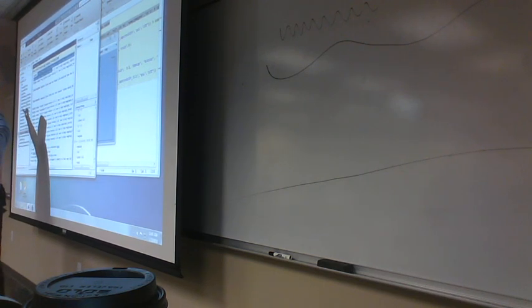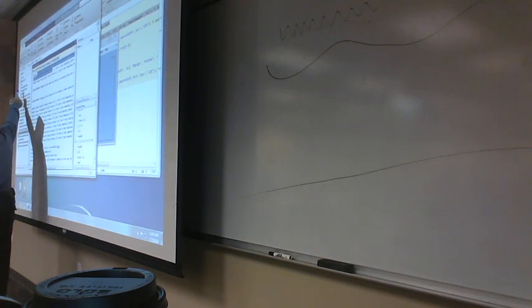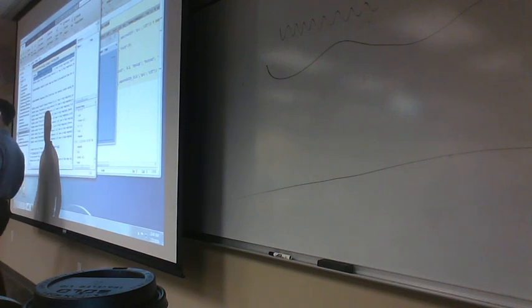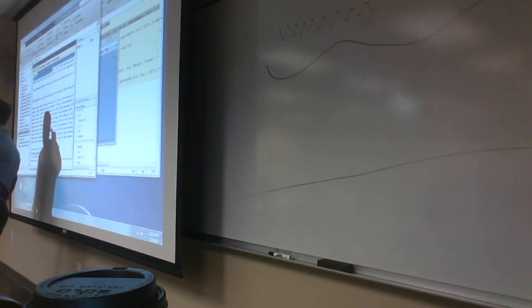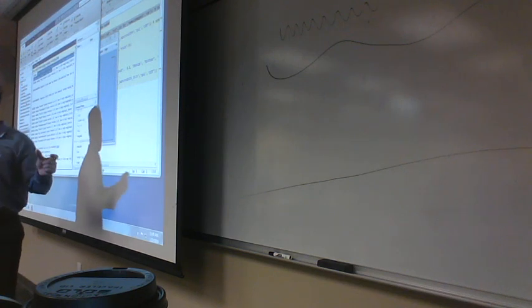We did start with this, but once we import it, save it, and filter it, saving actually creates two files. Notice that they have different suffixes: one is .set and one is .fdt. You always get two files for that subject's saving.